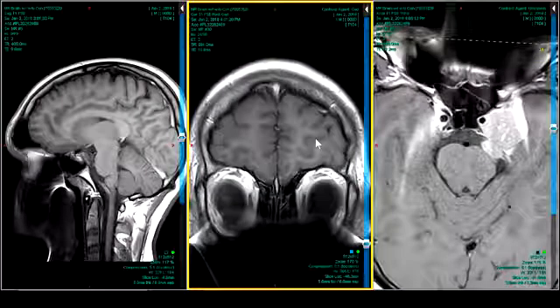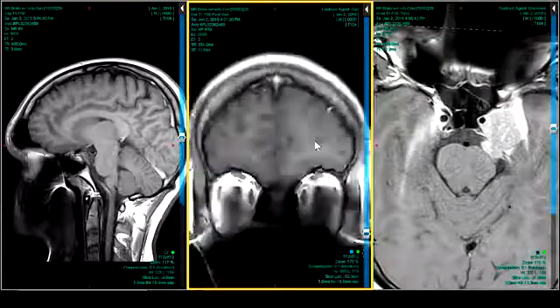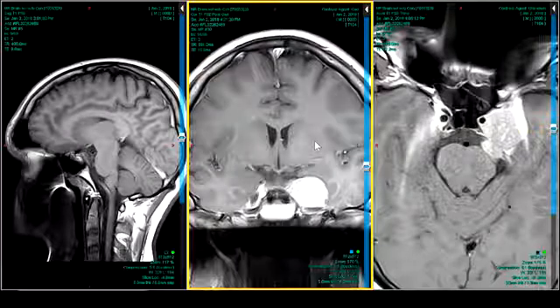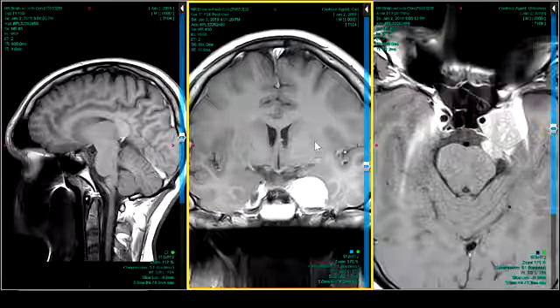The question is, would assessing cerebral blood volume have any value in differentiating meningioma from schwannoma? I don't know the answer to that. Does anybody? Clearly meningiomas have more vascularity. They're brighter, they enhance earlier. So if you did a cerebral blood flow analysis, the curve for a meningioma is going to look something like this.